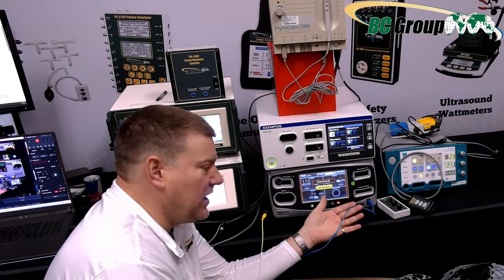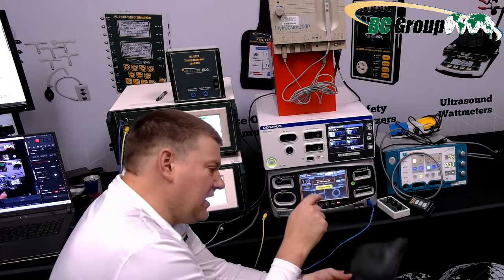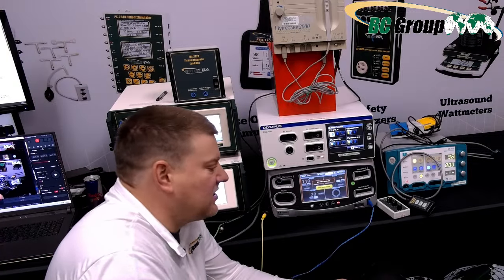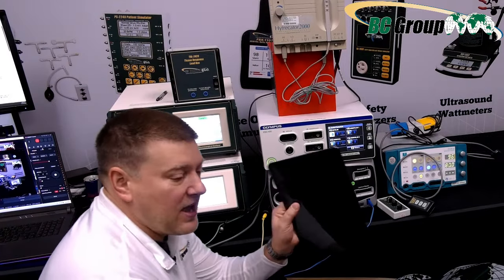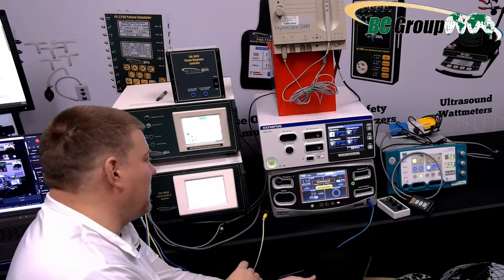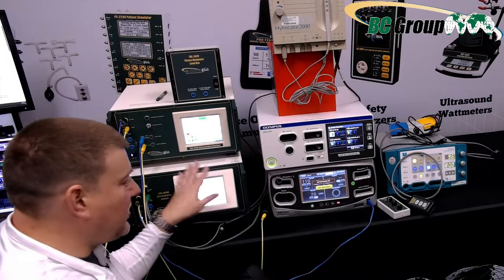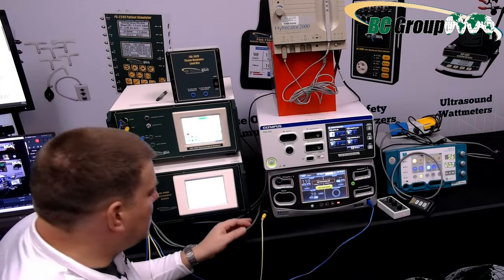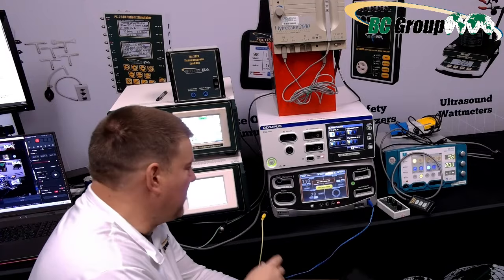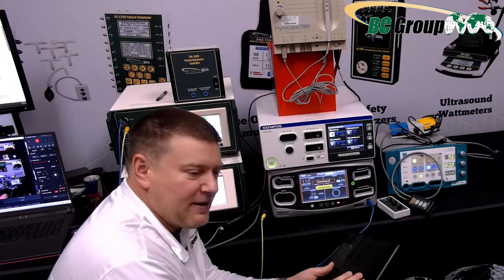So if you hit 135 ohms like we did today, and it goes, alarm, you hit stop, and it will capture that result. 135 ohms, that's a pass condition. Press on to the next. For energy capture, it says, like, set it at 100 watts. You set it at 100 watts, it automatically configures your ESU analyzer for the correct settings for this device. So if you're using these cables, I had to go through and set like bipolar, monopolar, and whatnot, configuring my foot controls. You don't have to do that. The app will do that for you.